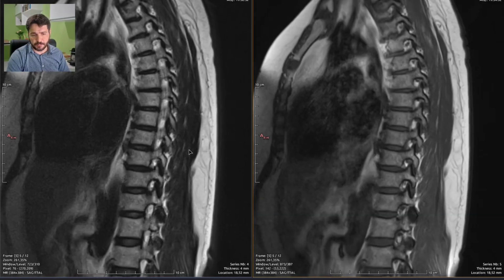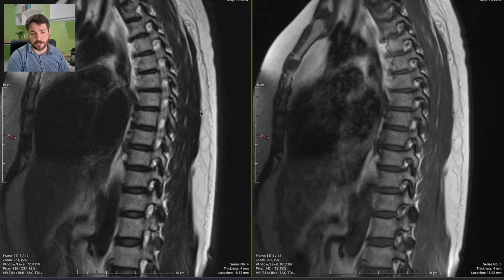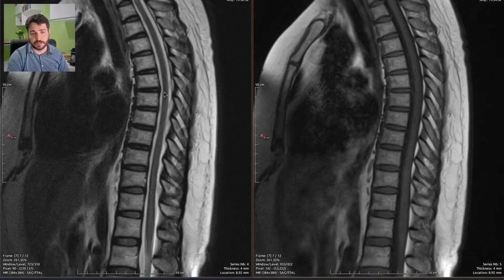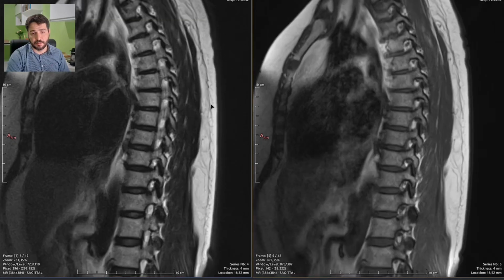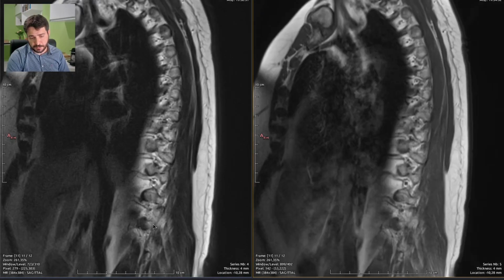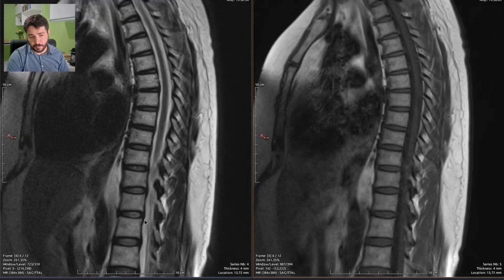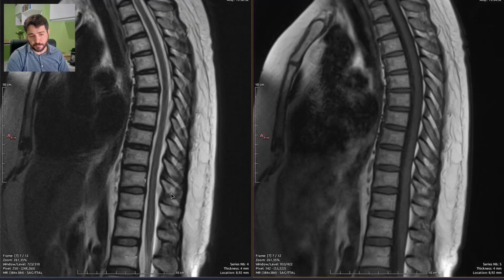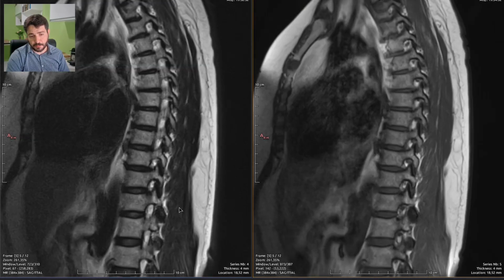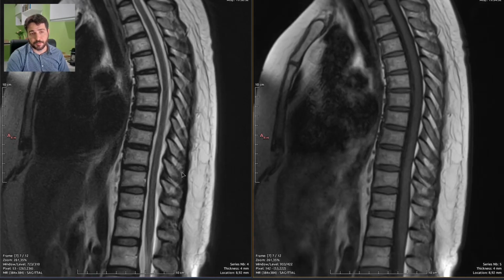which sequence is which. So I can see there is a small disc protrusion, a tiny bulging disc on this segment that has no neural repercussions whatsoever. Also, this is the last rib. This should be D12, and I think there is also a small protrusion right here that once again has no neural repercussions.